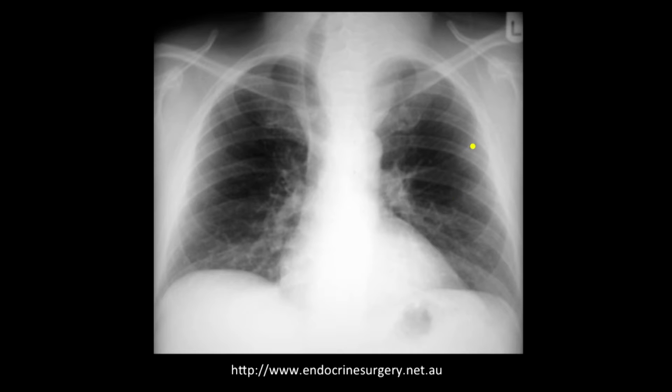So if we're looking at this patient, we want to make sure that the trachea is midline, and you can actually see that this trachea is deviated to the right. The most common cause of this is going to be a low-lying thyroid gland, so a retrosternal thyroid. Whenever we see tracheal deviation, you want to find out what exactly is causing that. Most common cause of this is a retrosternal thyroid, and then you can again appreciate the right mainstem and left mainstem bronchi. Great.